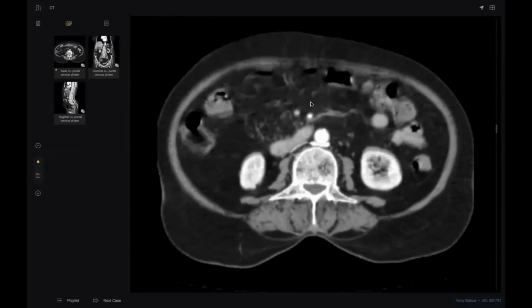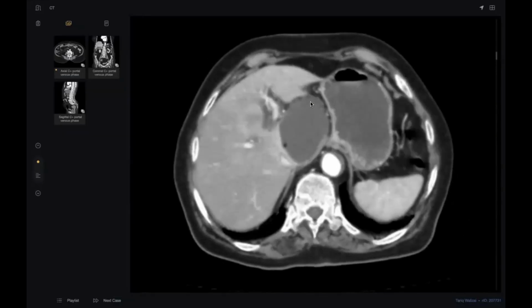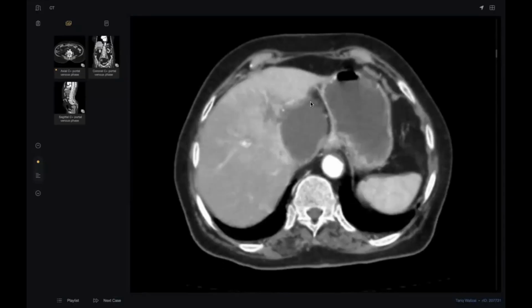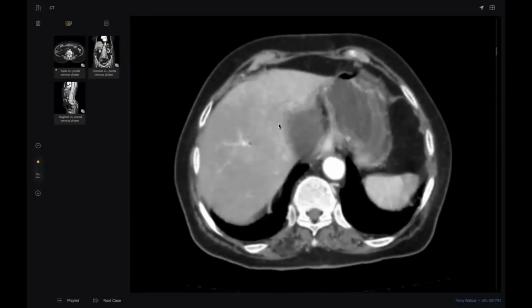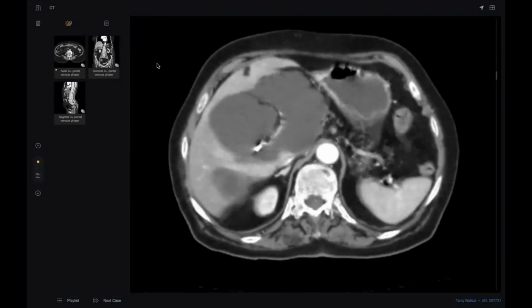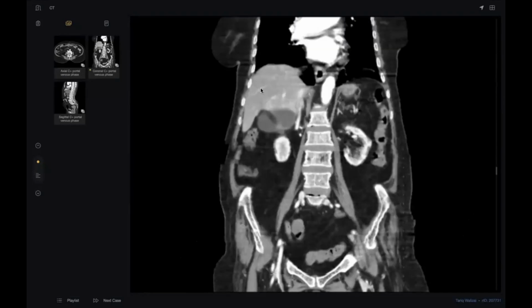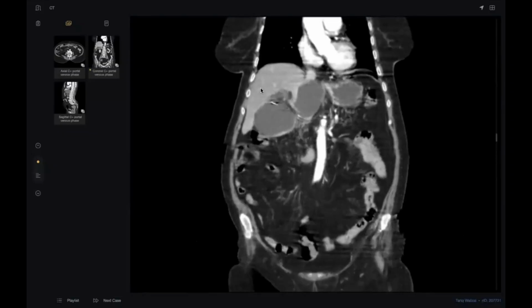See, this is a post-cholecystectomy. What happened here? Collection, so either leakage or infection. She told me she is searching for air loculi, this one. And you see, my colleagues, there is some peripheral enhancement. You should ask the examiner, doctor, does this patient have fever? The examiner will not ask you, do you want any history? He will not ask you like this.